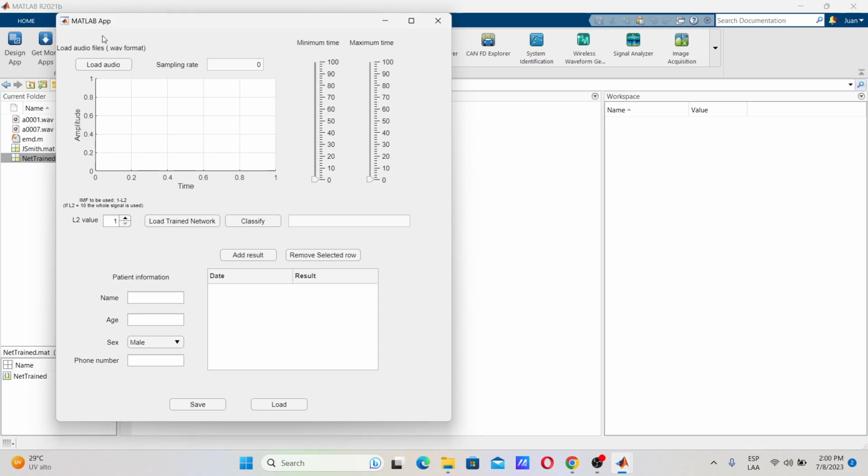Hi, welcome. The idea of this video is to show you how to use our application in MATLAB to classify PCG signals as either normal or abnormal. This can be used within a clinical context or for research purposes.